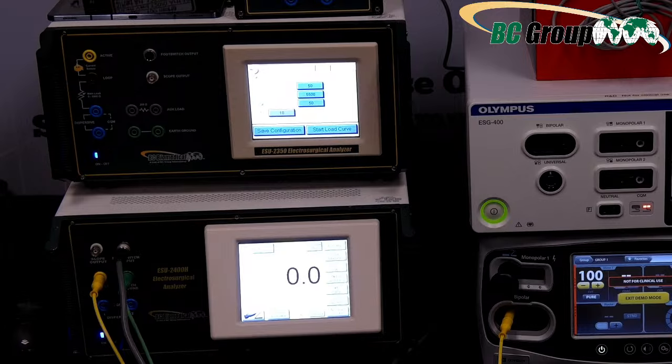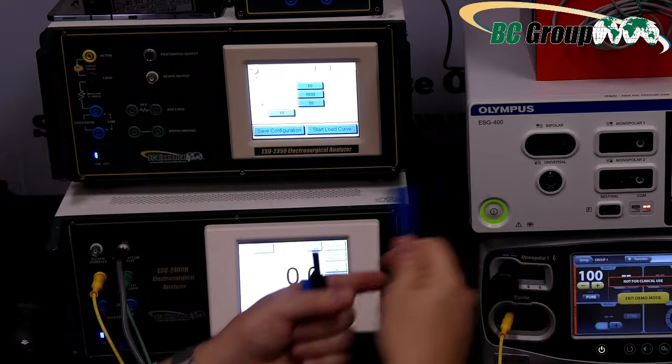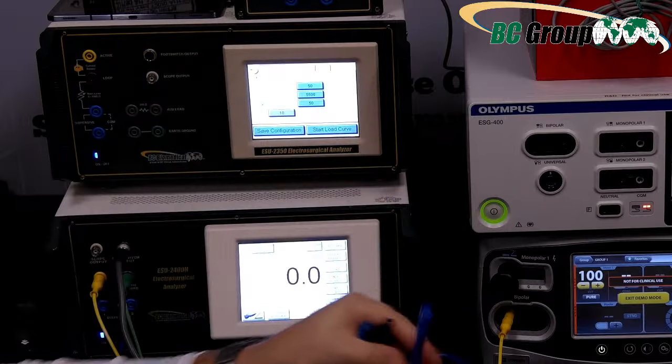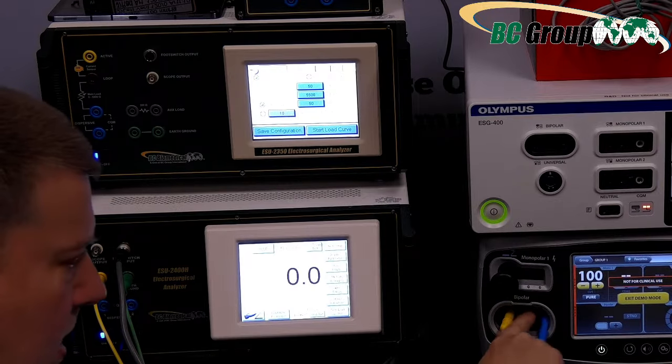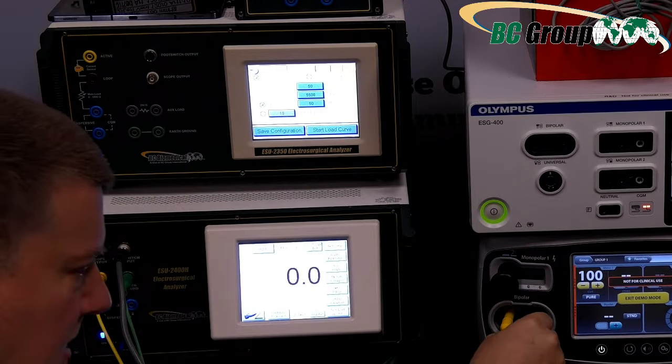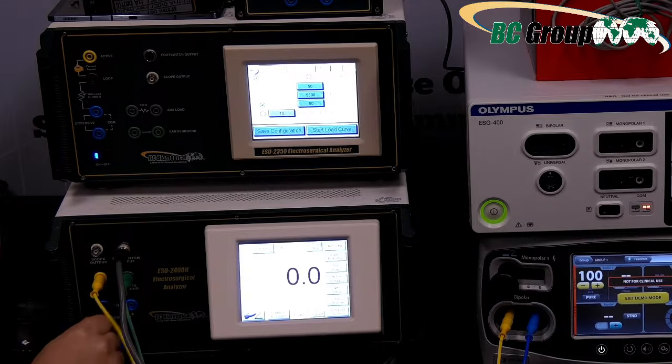So bipolar does not use a regular CQM port. I can actually remove that cable completely from the port. This is a monopolar cable, okay? For bipolar, what we're going to do is plug one into the second port over here and make sure you depress the little button that's there. And then this guy here is going to come over to your other CQM, just like that.